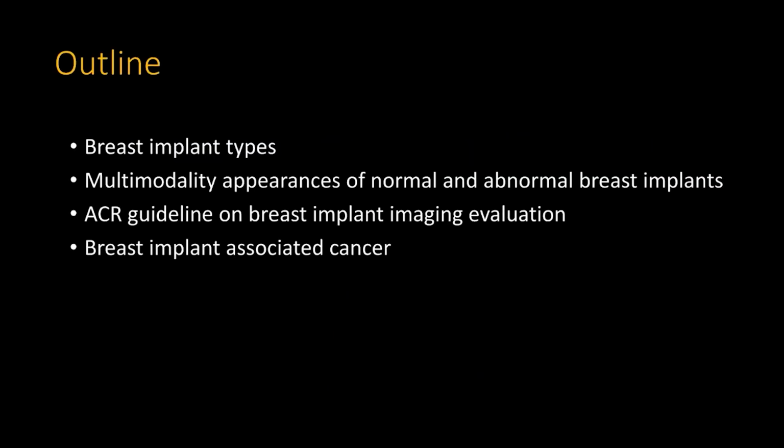Today, we are going to focus on imaging evaluation of breast implant. Here is the outline of this talk. We are going to start talking about breast implant type, and then we are going to review the abnormal and normal appearance of a breast implant on multiple breast imaging modalities such as mammogram, ultrasound, and MRI. Later, we are going to discuss the ACR guideline on evaluation of breast implant integrity. And finally, we are going to finish up discussing the breast implant associated cancers.